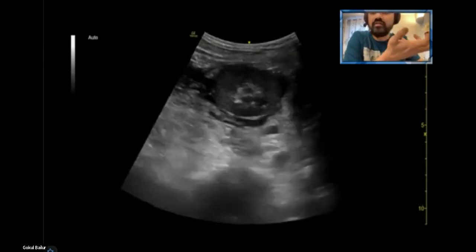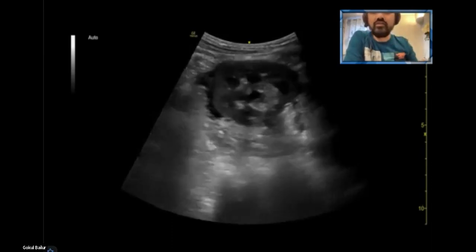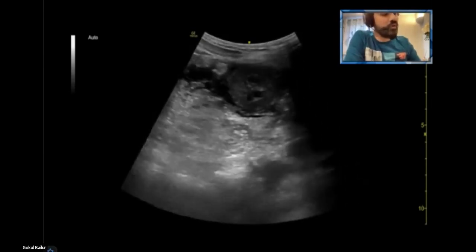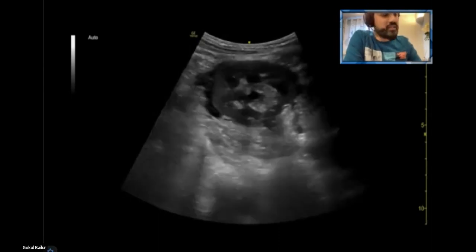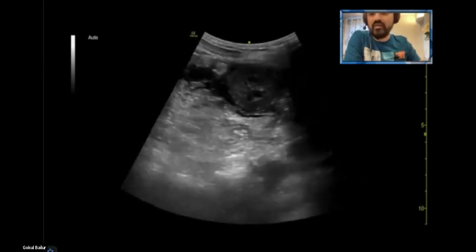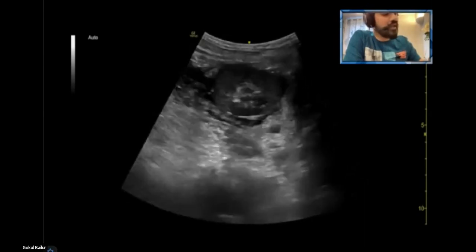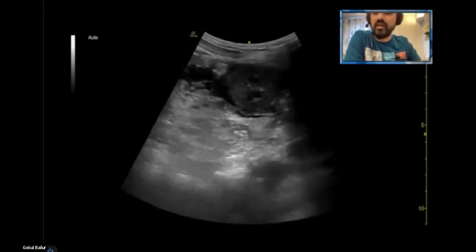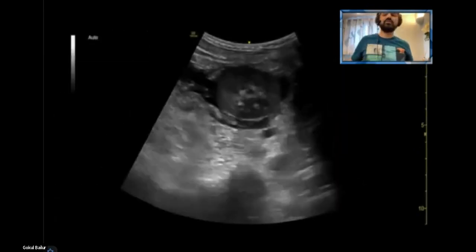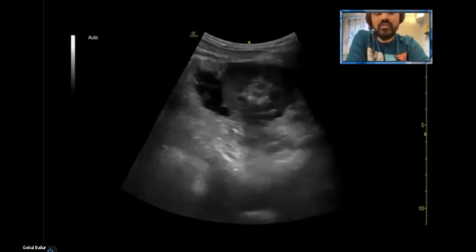So looking at the bloods and initial presentation, together with the PoCUS findings, we had the diagnosis at this point. This was probably out of hours, and getting a CT scan based just on the blood and initial presentation would have been hard, knowing that the patient was getting better with the painkillers. But I think ultrasound helped us expedite that, and we got a CT scan. The CT scan showed 3 distal ureteric calculi, the largest being 6 millimeters.